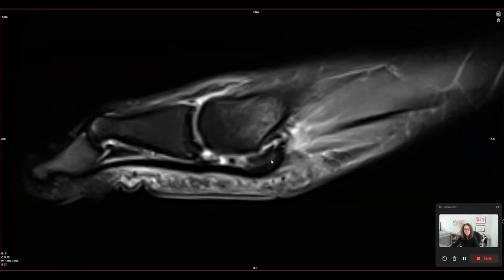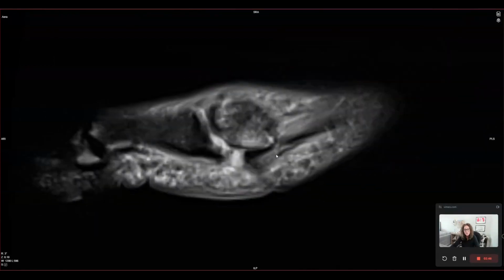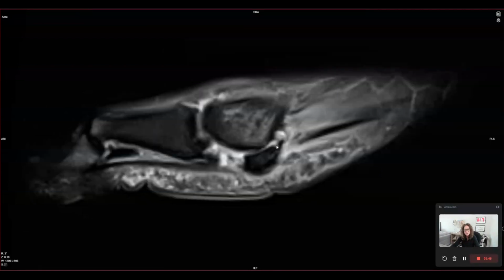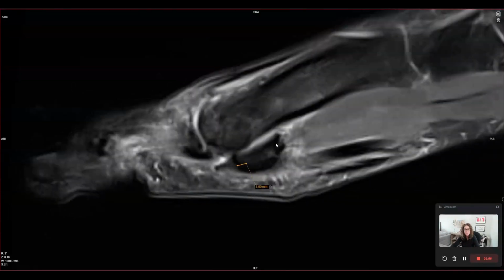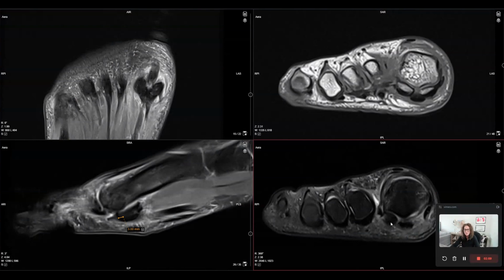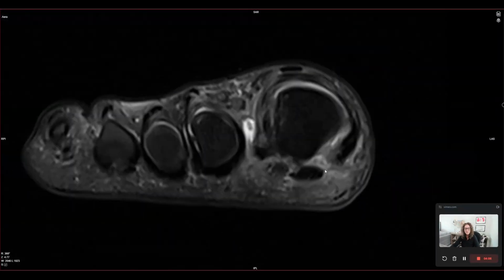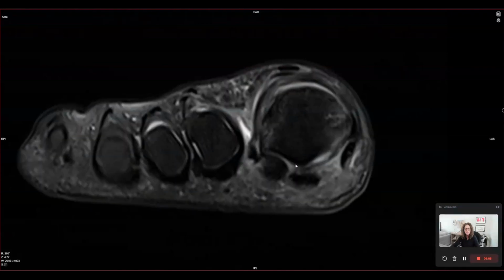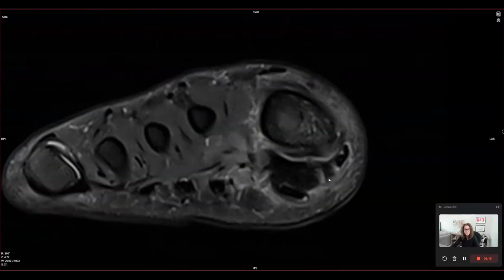Lastly, we can take a look at our sesamoidal metatarsal ligaments. Let's go to the medial side here. And we can see sprain of the sesamoidal metatarsal ligament, seen here, that there are still fibers there, but there is edema. And of course, moving to the lateral side, we can appreciate that they are intact, seen better on the transaxial images. So all in all, our findings so far, we have our sesamoidal phalangeal ligament tears, medial and lateral. We have a myotendinous injury of the abductor hallucis and the flexor hallucis brevis.